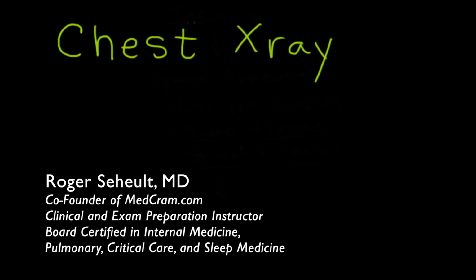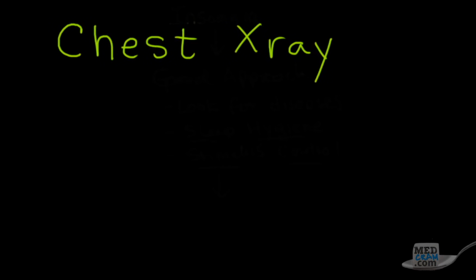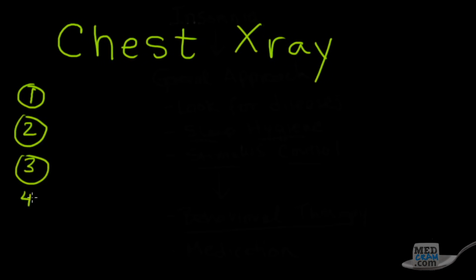We're going to talk about chest x-rays today, how to interpret them, how to review them in a systematic way. So an x-ray is simply a film that is looking at material hitting the film and causing it to either be dark or white. It's a black and white film. And that correlates to about 5 different areas of density. So everything's black and white.